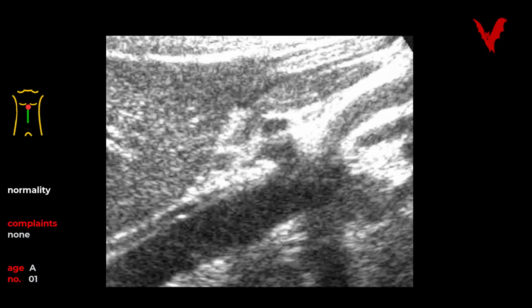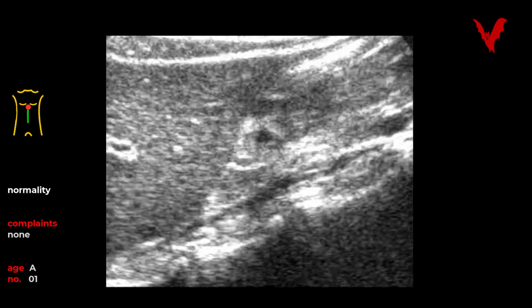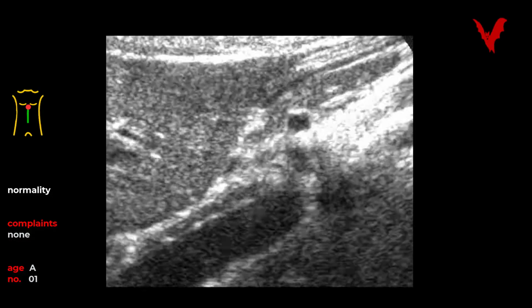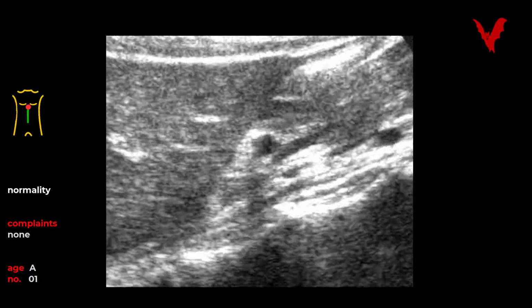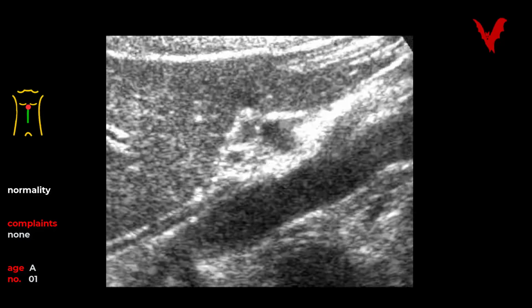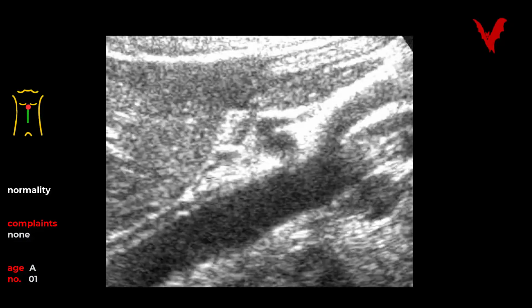The liver, the second biggest organ in the body, is multi-shaped, with normality and pathology in fluent transition, a topic too vast for claiming completeness. Therefore, we point to older non-electronic literature, for example, Günther Schmidt et al., Sonographical Differential Diagnosis.